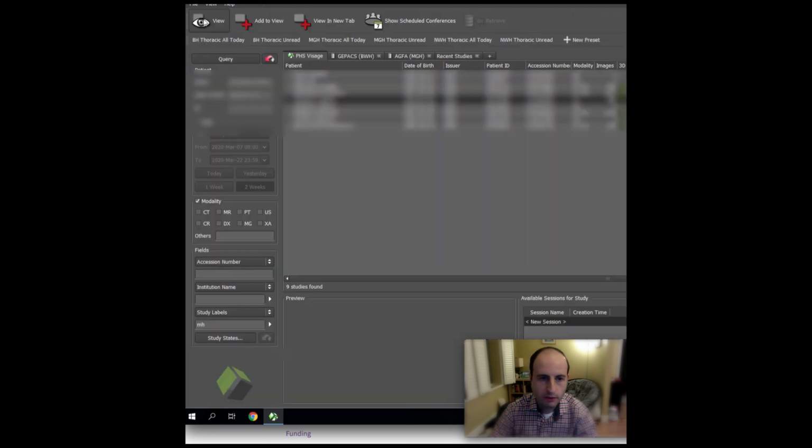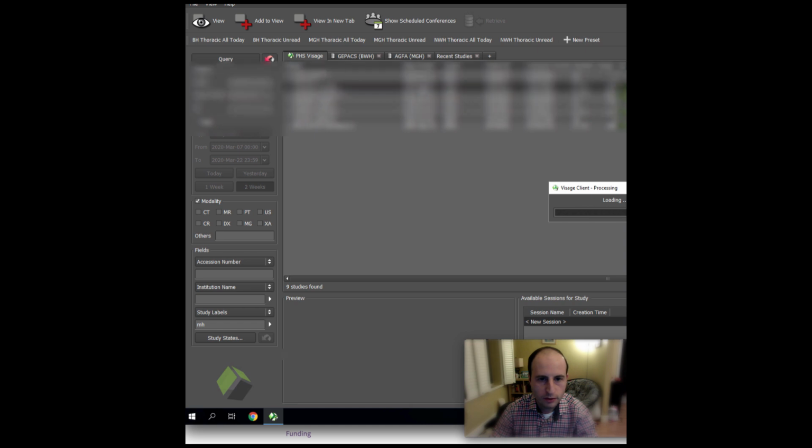But again, we should remember that while these imaging features can sometimes be suggestive in the appropriate clinical context, there's obviously a large differential and it depends on your clinical history. And so I'll show you several examples of other cases that would fit with what's typically described for COVID, but are in fact other diagnoses.